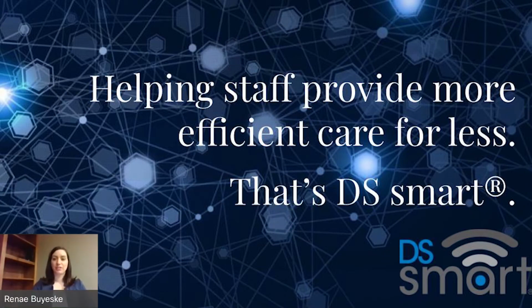Really appreciate everyone taking the time out of your busy days to join us today and learn a little bit more about DS Smart. DS Smart is Direct Supply's app-based platform to help you connect clinical data from your clinical pieces of equipment directly into your electronic medical record. I look forward to talking through with you today and showing you what the system's capabilities are, and following up with anyone that is interested in more information after our demonstration today.